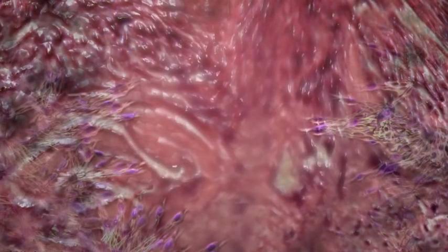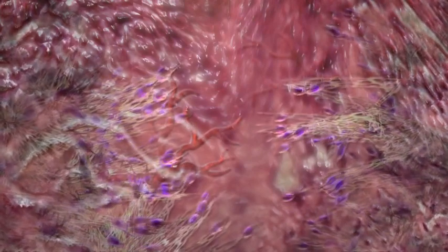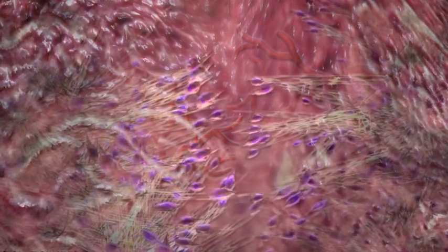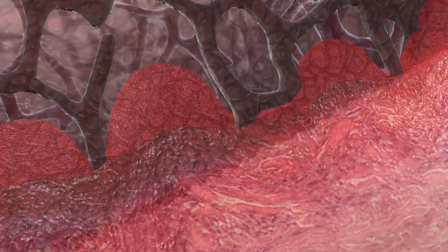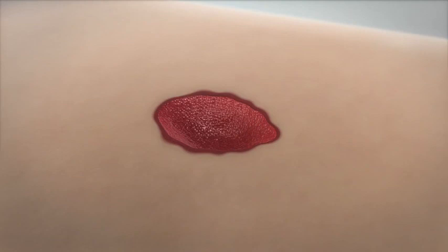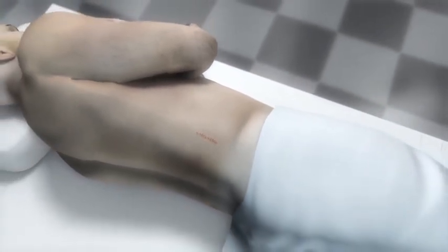In vitro and in vivo studies conducted using negative pressure have shown that these activities include increased metabolic activity, fibroblast migration, cellular proliferation, and extracellular matrix production. All of this cellular activity leads to the formation of healthy granulation tissue in the wound bed and the characteristic undulations that have been seen in wounds treated with VAC therapy. Over subsequent dressing changes, the granulation tissue fills the wound bed, further reducing the volume and preparing it for final closure by secondary or delayed primary intention.